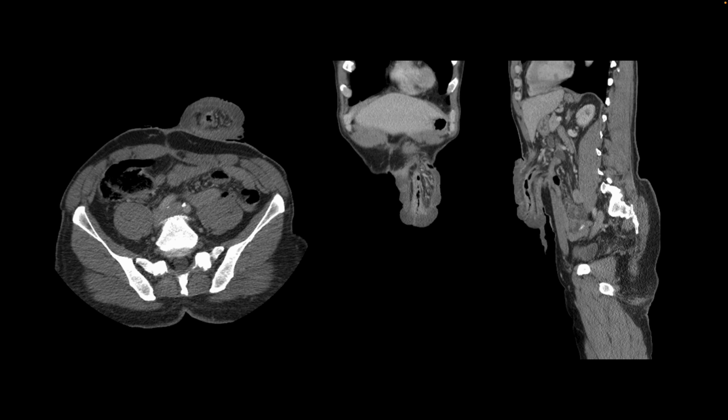This is our next patient. They have had a surgery and a colostomy, and we see a complication from colostomy where the loop of the bowel that is supposed to open outside on the skin is now hanging outside the abdomen along with its regional mesentery. And so here we see prolapse of the colostomy loop outside the abdomen. And so when you see this, let the surgeons know that this has happened and the loop is hanging outside the patient, which is called a prolapse.